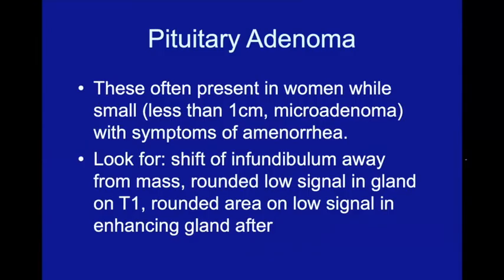So you can see the enlarged sella, and you can see that they often have some joint disease as well. And so the reason for the enlarged sella is that in patients with acromegaly, usually the tumors are quite large by the time they're discovered. This is unlike the Cushing's cases where the tumors can be quite small at the time of imaging. So you're kind of looking for different things, and it makes sense because the changes are often recognized late in patients with acromegaly, where the manifestations of Cushing's disease come on quite early.